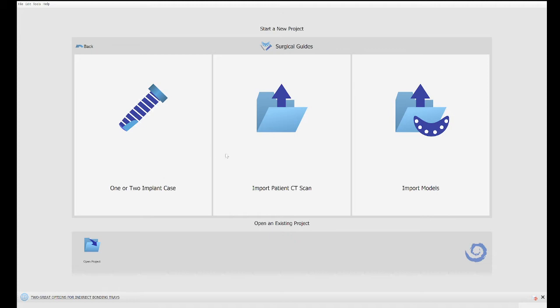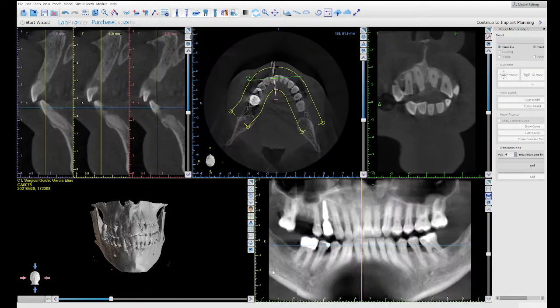These windows that are going to open, go ahead and click OK. These are just telling you what patient it is and all the demographic data, I mean the last name and name of the patient. You click OK, and it's going to start reconstructing the DICOM. This is a field that you're going to be seeing. Usually I don't mess with that, so it really doesn't matter. So I'm going to go ahead and click OK, and then it's going to go to the main window.